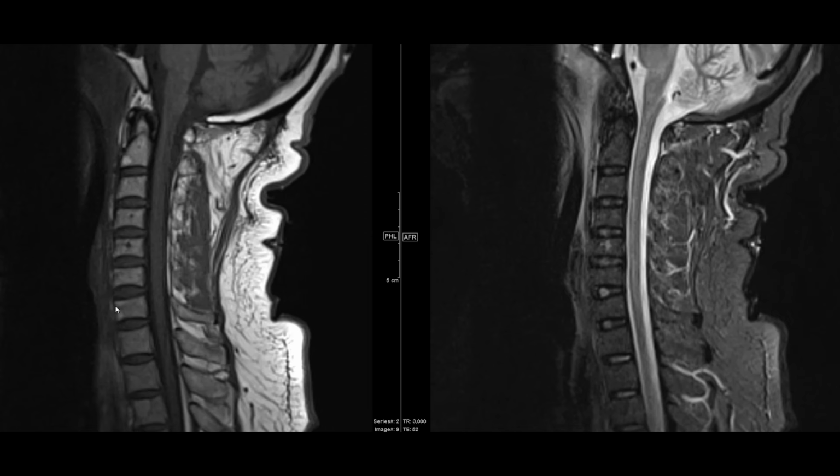Similarly, if you come down here and look at this vertebral body, adjacent to the end plate you see some areas that are a little T1 hyperintense. That's just a little focal fat around the end plate, again, because you don't see it at all on the STIR image here. Now there's another little focal area in the C5 vertebral body.